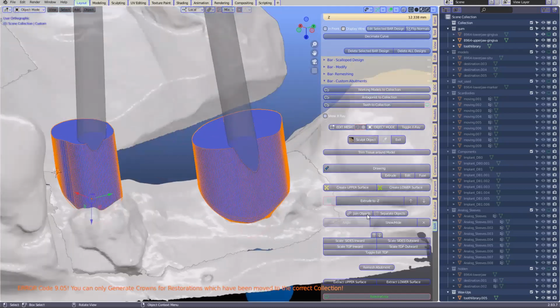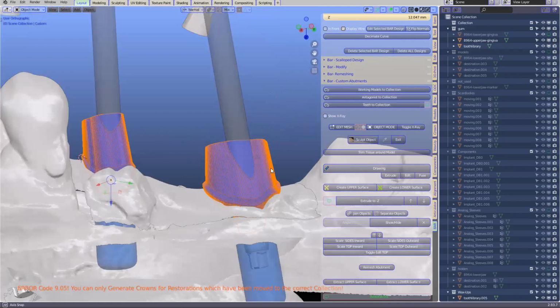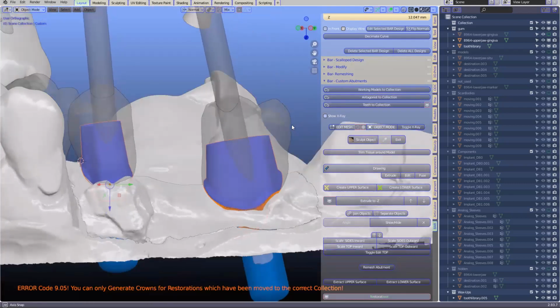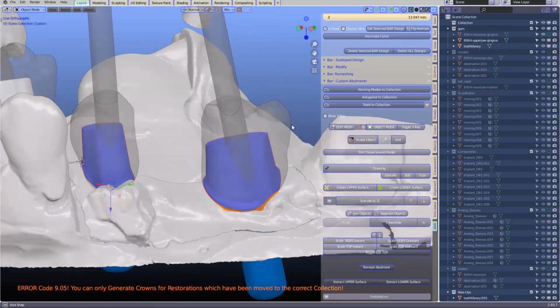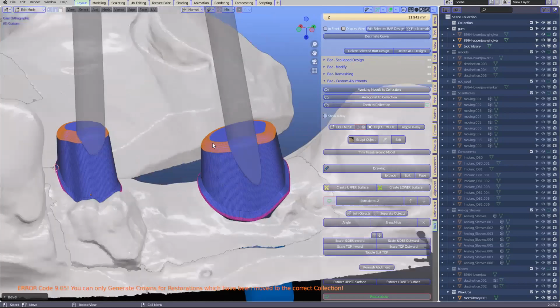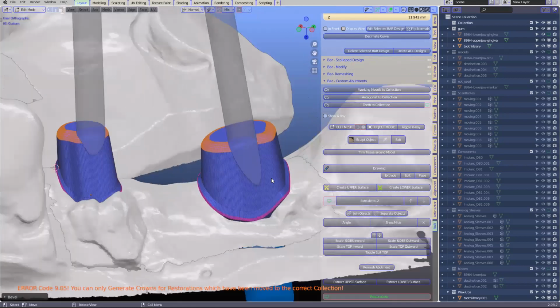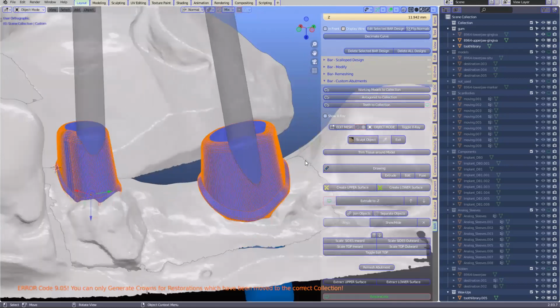Yeah. So, okay, what we'll do is we'll move the sides inwards like that, as much as you want, and then we'll scale this inwards. So it's scaling it inwards like that. All right, so here we go. That's looking quite good. We will select the top, Control B on the keyboard, move it, and here we've already got our pre-selected curvature, our bevel.